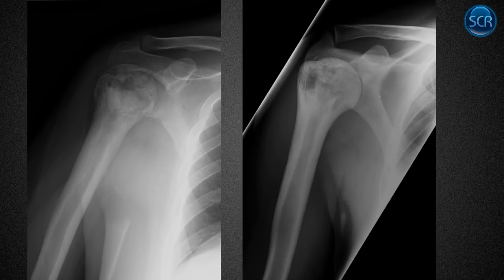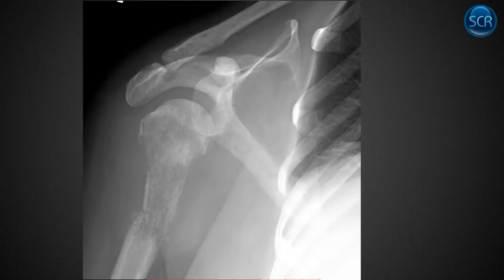What are we seeing in this one? This humerus has thickened cortex, has trabecular coarsening, and maybe a little bit of osseous expansion. This is a classic example of Paget's disease. That's the triad: osseous expansion, cortical thickening, and trabecular coarsening. So this is a mixed to purely blastic phase of Paget's disease. When it's in the earliest phase, of course, it's going to be lytic, with an advancing edge of osteolysis, those types of things. So you may see that in the shoulder.